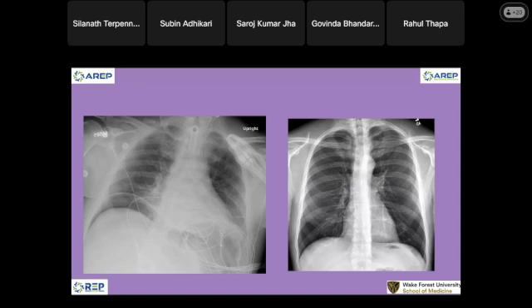I would say, okay, we already look at the medical record. If this person has no infectious symptom at the beginning, no history of any surgery, I would say likely not any kind of pneumonia. Treat the patient, come back here and repeat the chest radiograph. It's leaking from everywhere. If the patient is old, so I'm gonna ask for CT. See, the decision making is different according to the clinical context. Either duodenal ulcer perforation, gastric ulcer perforation, or even sometimes colon cancer can have perforation, or diverticulitis. These are things you need to do something about when you see leaking from the GI tract on a chest radiograph.